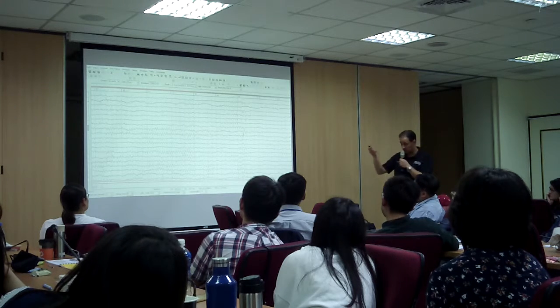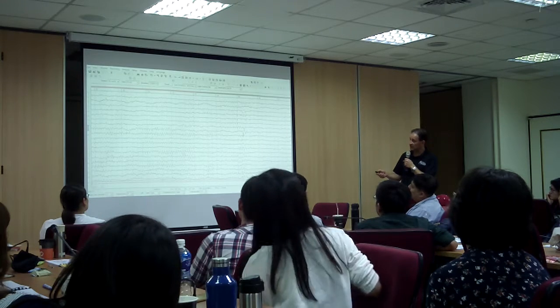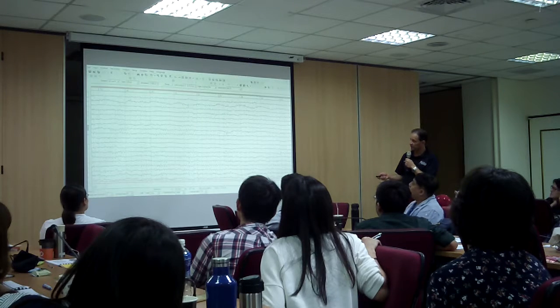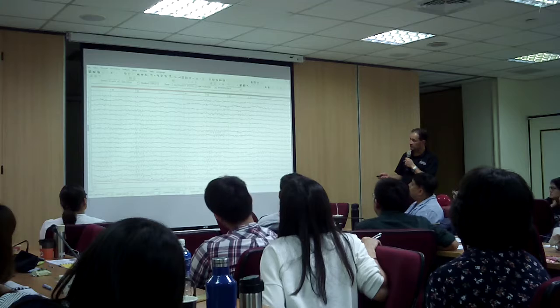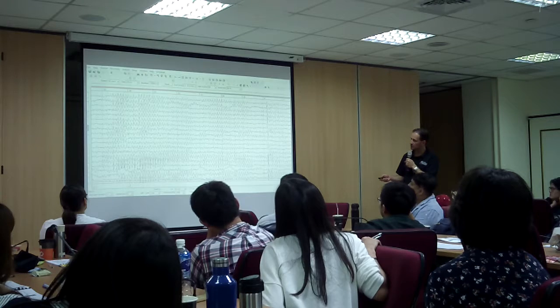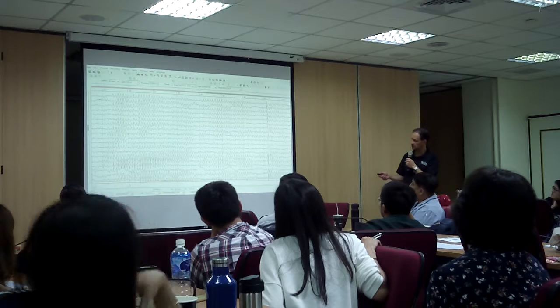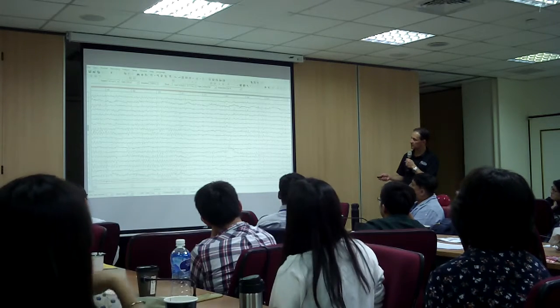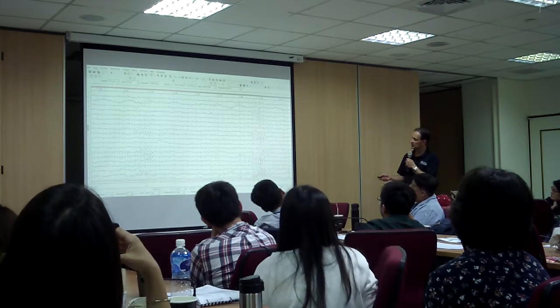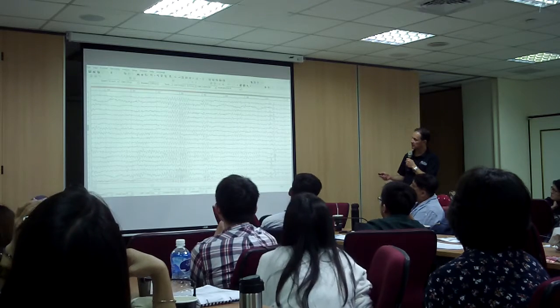So I'm going to fast forward. Let me know if you see it again. F7, F3, F7, T3. Okay. I'm going to move slowly, and if you see something that resembles it, let me know. Here. Again here, very nice. Good. And again right there.